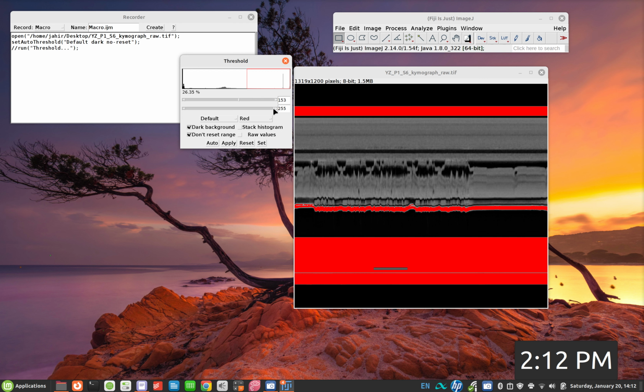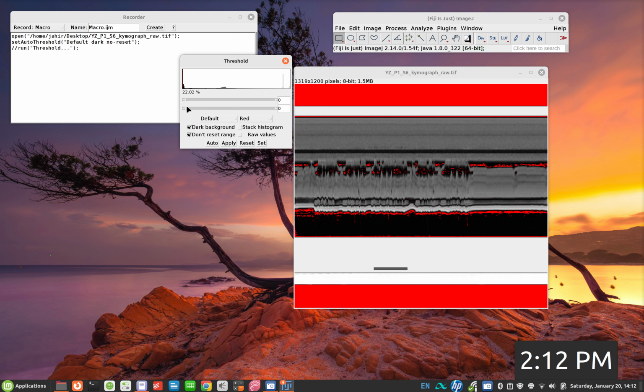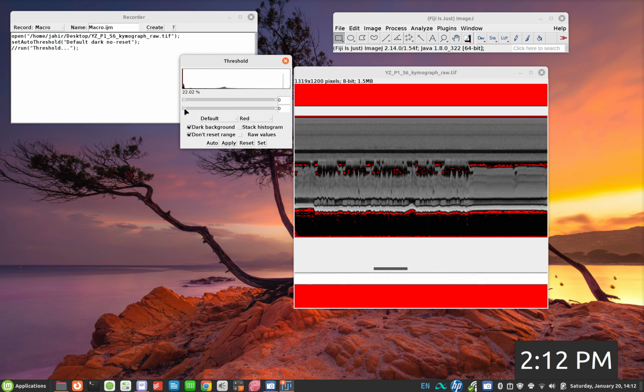If you slide the bottom one to the left, it will force both the sliders to the left edge. Now keep the first one at 0, the second one, the bottom one, gradually move to your right, and then see, our purpose is to cover all those black pixels with the red color, red shades.